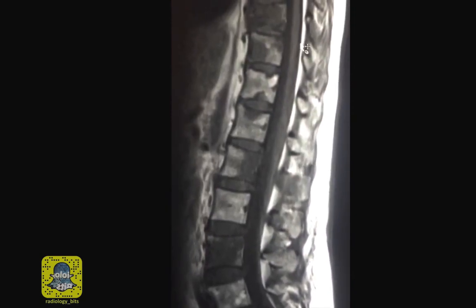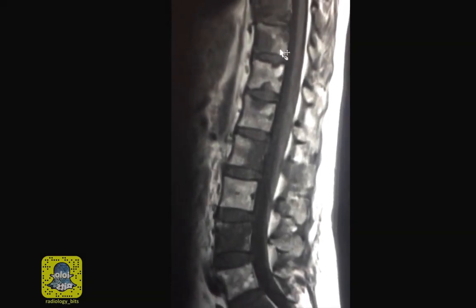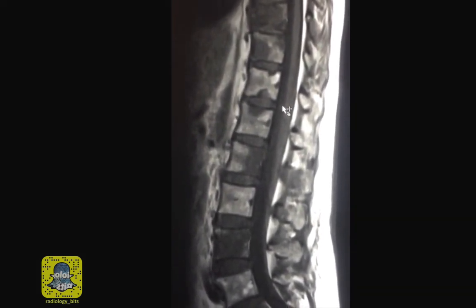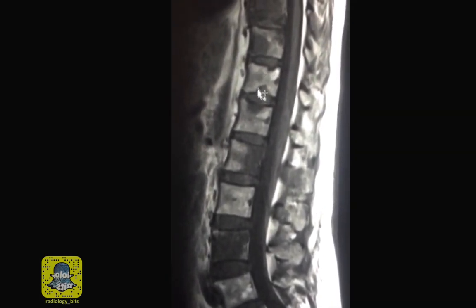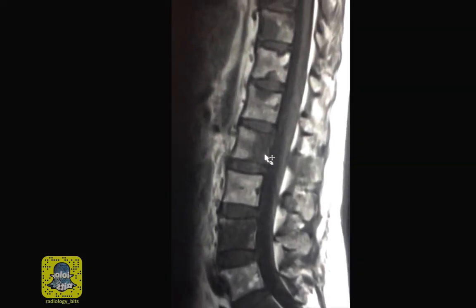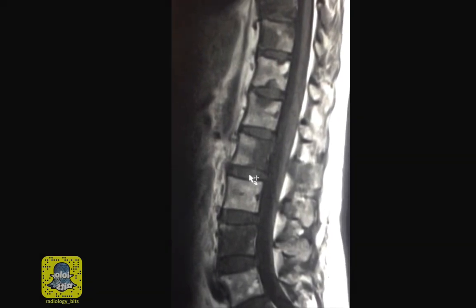And this is the sagittal lumbar spinal T1 on that same abnormal patient. On this T1 where CSF is dark, it's much easier to appreciate the contrast between what we saw as normal and abnormal here. The bone marrow appears extremely heterogeneous. Although you have areas of normal, bright yellow marrow, you do have other areas that are extremely dark, even darker than the adjacent intervertebral disc, which is abnormal.